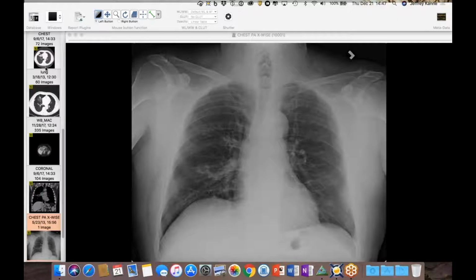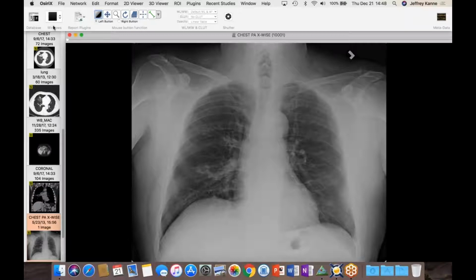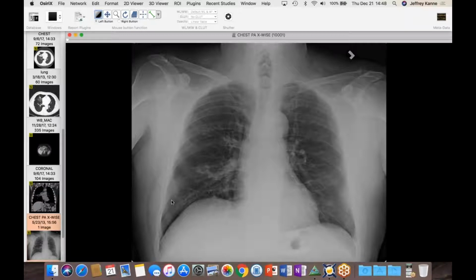Okay. You see our chest röntgengram, as God would say. All right, so this is a companion case to yours, Howard. This is a middle-aged man, I forget how old, who presented with cough and was noted to have this abnormality on a chest radiograph, and this was about 4 years ago.